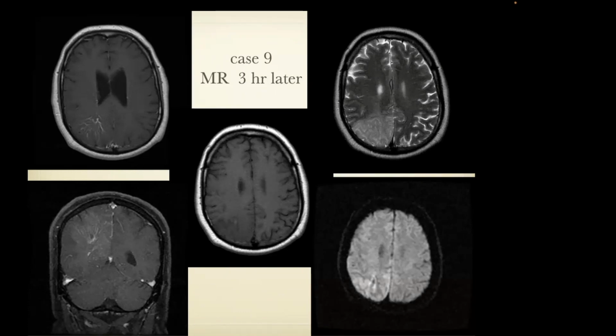It also illustrates why it's important to identify developmental venous anomalies in patients going to surgery, because the surgeon cannot usually sacrifice a DVA, because this is not a redundant venous drainage. This is often the only venous drainage to a portion of the brain and cannot be sacrificed.